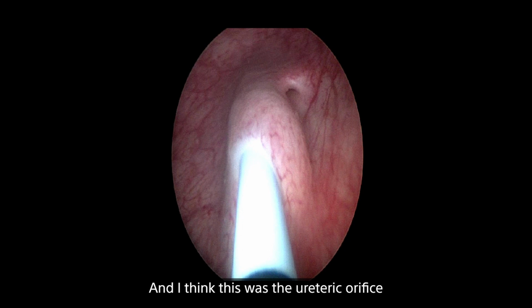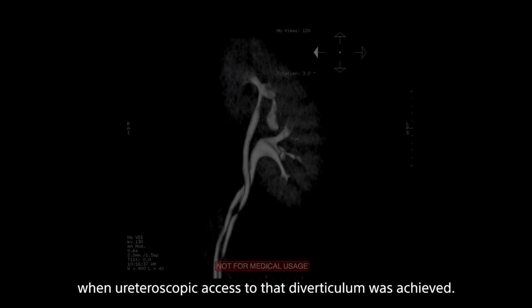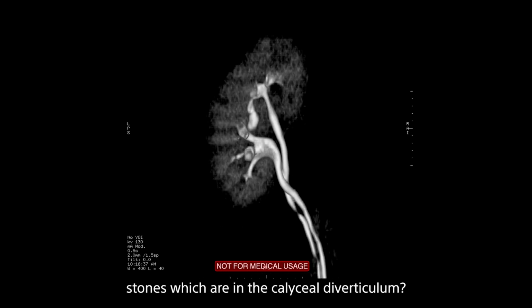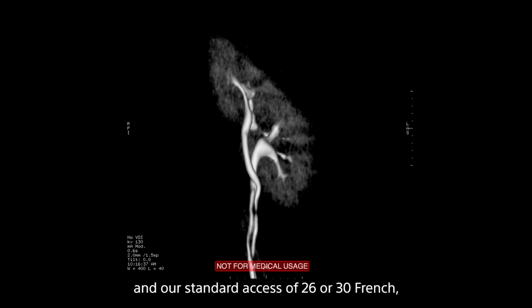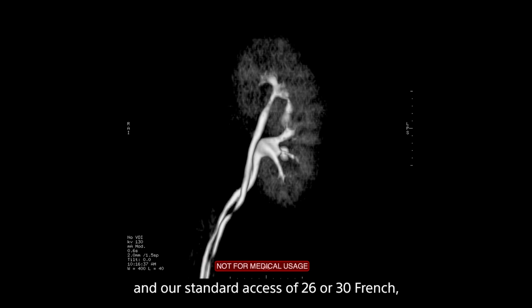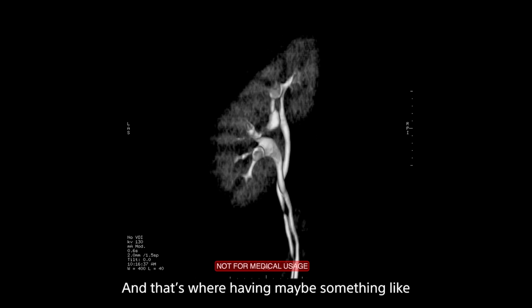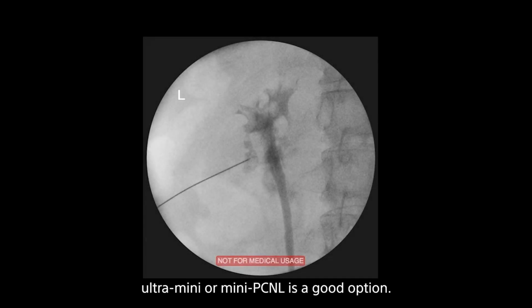And I think this was the ureteric orifice that was accessed at the first operation when ureteroscopic access to that diverticulum was achieved. So the next question then is, how are you going to manage these stones which are in a calyceal diverticulum? You can see the diverticulum is absolutely tiny, and our standard access of 26 or of 30 French, I would say is going to be too large to access that diverticulum. And that's where having maybe something like ultra mini or mini PCNL is a good option.